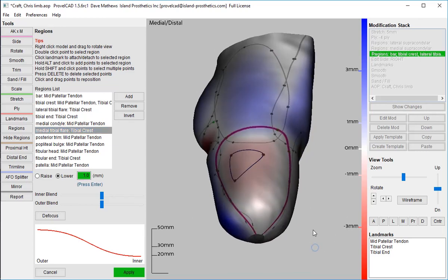I think I'll move that up a little bit as well. You can click anywhere on one of those handles and shift the whole region around. I think I'll do that. Looks fine, but I think I'll do this. Reshape it a little. There we go.